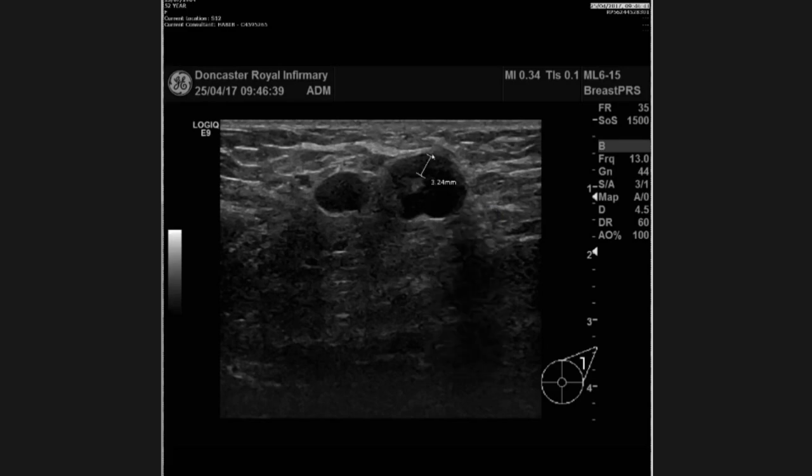It's huge. So this is definitely biopsiable, but some centers only do 2.5 millimeters and above. But we do 2 millimeters, and we seem to have a decent pickup rate. Sometimes the lymph nodes are just completely replaced by tumor. So my BI-RADS score would be M5U5 for this lesion.